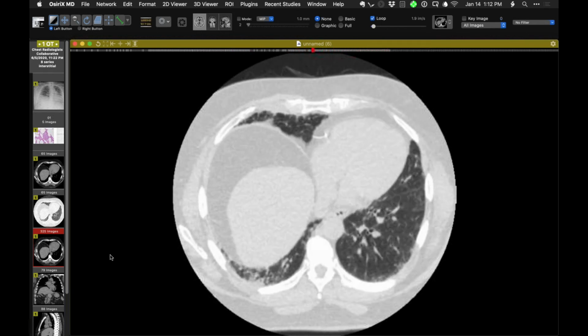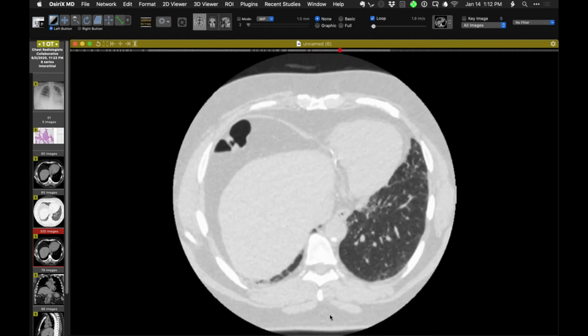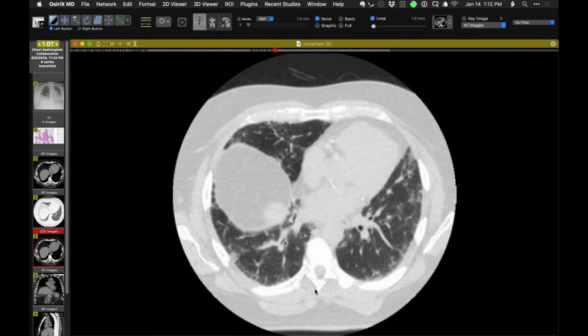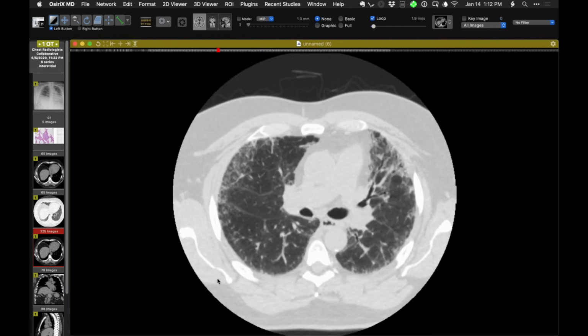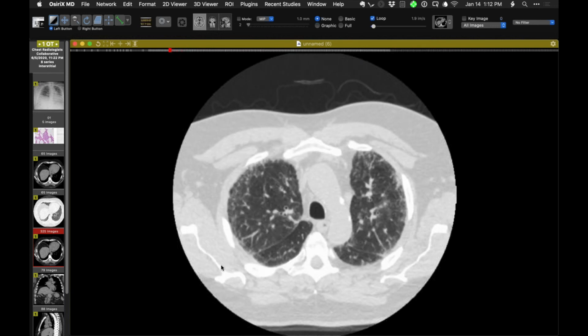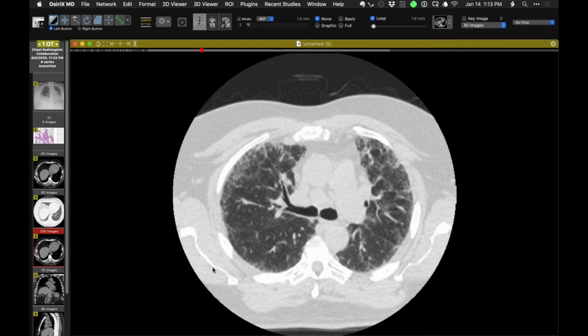Again, in looking at the lower lung zones, there's a rather conspicuous absence of at least basilar subpleural traction bronchiectasis and no definite honeycombing. And you can see again that away from the pleural surfaces, there are areas of, one can infer, traction bronchiectasis or airway-centric fibrosis, for example, here.